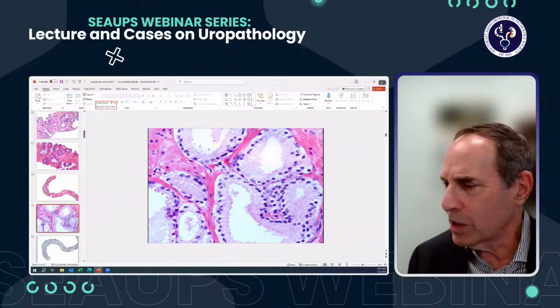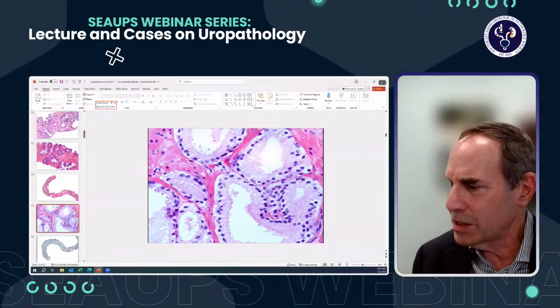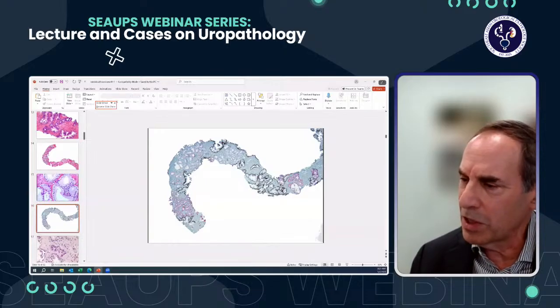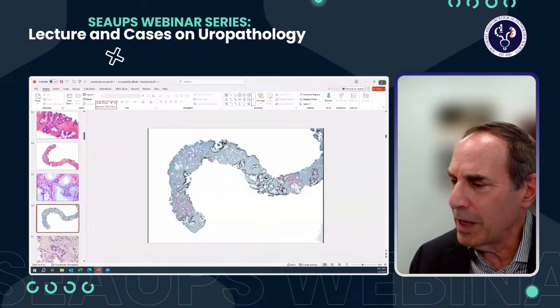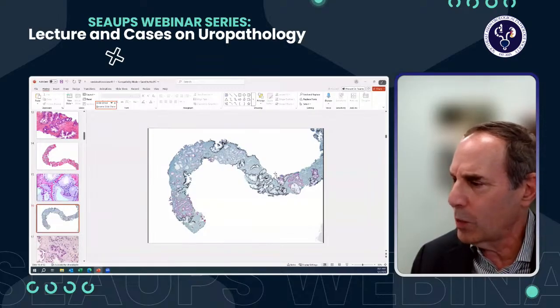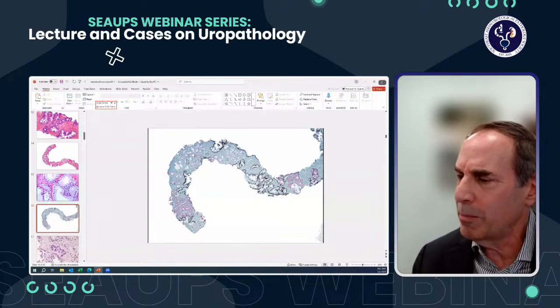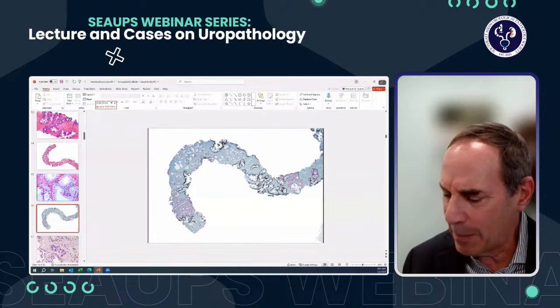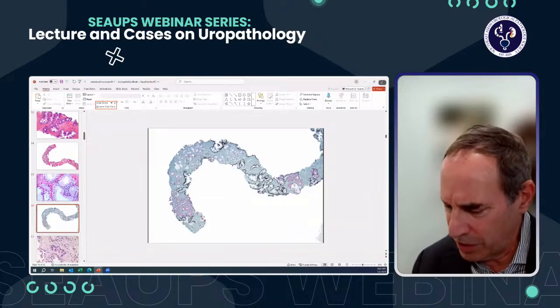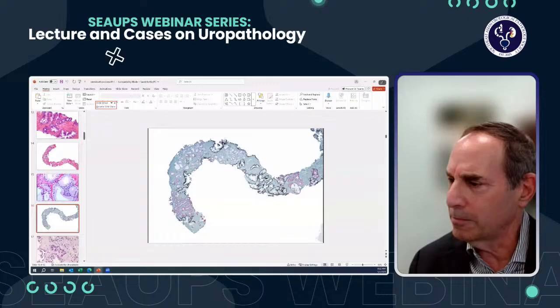And the only way I would feel comfortable diagnosing cancer in this setting would be if you can show, with the use of basal cell stains and racemase, but more importantly the basal cell stains, that all those glands that are crowded are entirely negative for basal cells. No patchy staining anywhere else. But you have to be extremely careful diagnosing cancer solely based on crowded glands in the absence of any of the cytological features that I mentioned are more common in cancer than benign.